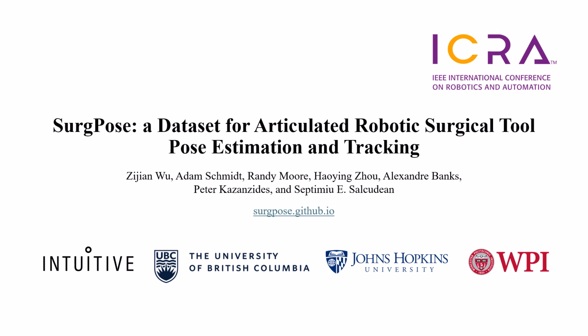In this video, we introduce our ICRA 2025 paper, SurgPose, a dataset for articulated robotic surgical tool pose estimation and tracking. In this work, we create a new dataset for the articulated surgical instrument pose estimation task. So far, SurgPose consists of 30 trajectory videos.